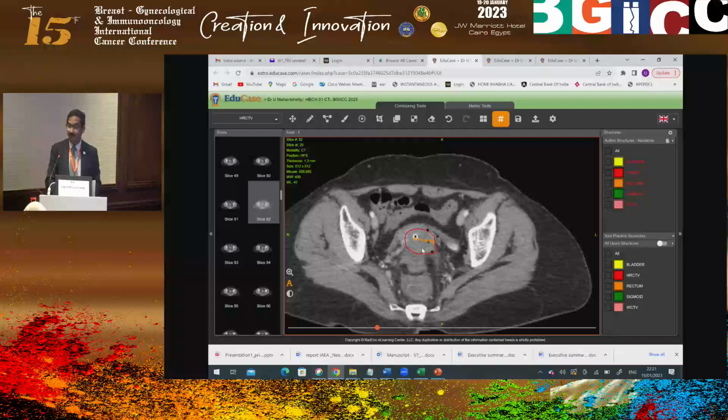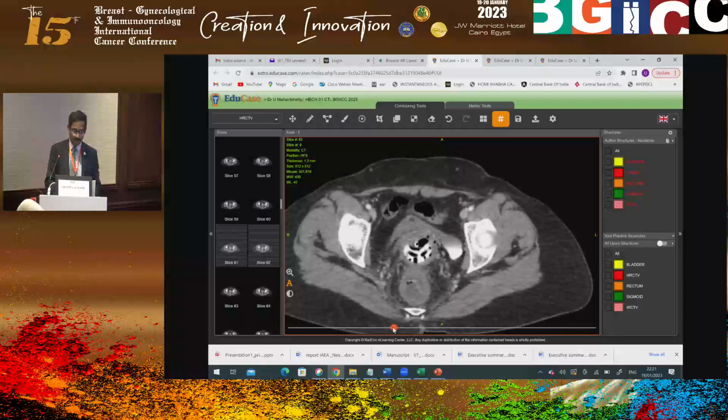Okay, so that is how you would shrink and make sure that your contour is efficient, because time and again when we used CT for contouring, in the parametrial tissue we always overestimated because we don't know what is happening on CT in parametrial tissue. Now we have reduced that by two things. One is clinical examination and I am measuring NMD. Second is, if you are doing a TRUS, then you have that measurement. By these two measures, you can very easily contour. So then you want to go down, go down.